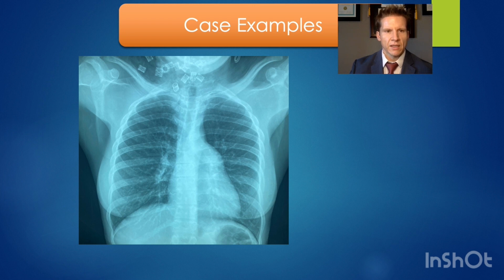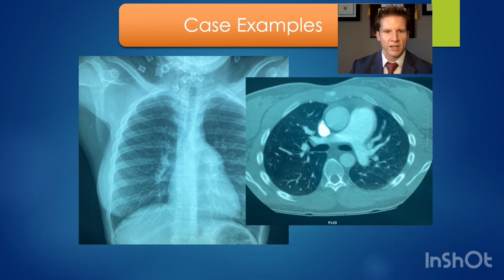So this is a young lady with sickle cell who actually has pulmonary arterial hypertension. On a chest CT, this is what the corresponding abnormality looks like. This is through the main pulmonary artery. We can see contrast in the main pulmonary artery and the SVC here. We're seeing it next to the aorta. The detailed anatomy of the CT can be further addressed in a later lecture. But for now, you can just use this to visualize how this convexity here can show up as a convex margin of this left heart border on the X-ray.